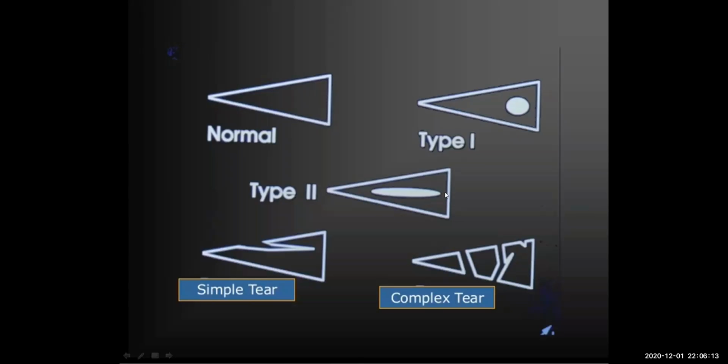Before we leave this slide, I just want to mention, my colleagues, that in most cases type 1 is like a normal variant. Sometimes you find that patients have a good rich blood supply to this area, especially in pediatrics. Type 1 in pediatrics could be normal, and this is nothing but an increase of the blood supply of that area.